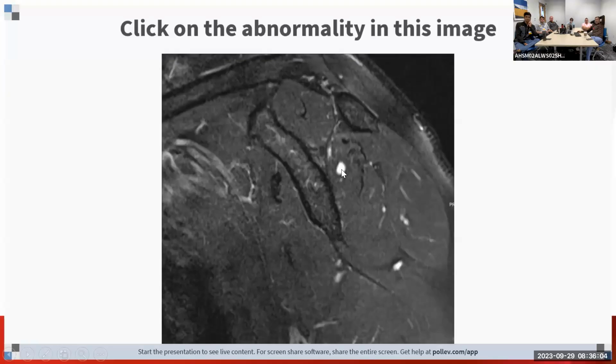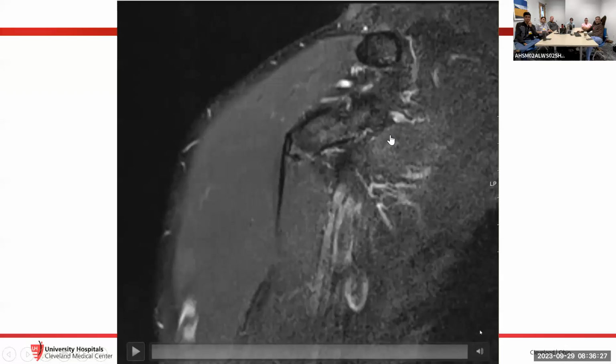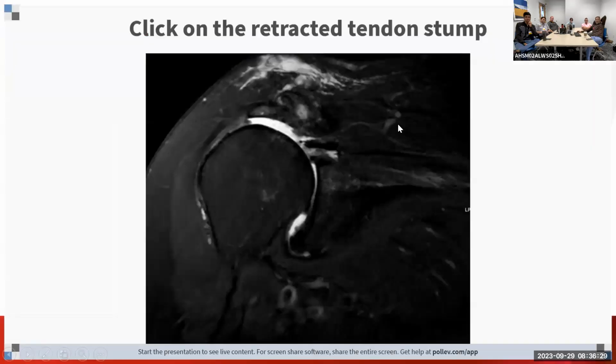This is our sentinel cyst sign. So if you ever see a cyst extending into the infraspinatus, that's basically diagnostic for a tear somewhere. That's allowing for fluid to insinuate along that myotendinous junction. So look for that as a secondary sign. You can see here's that cyst, and I think there's some video images that will show that there was some component of tearing at the footprint.